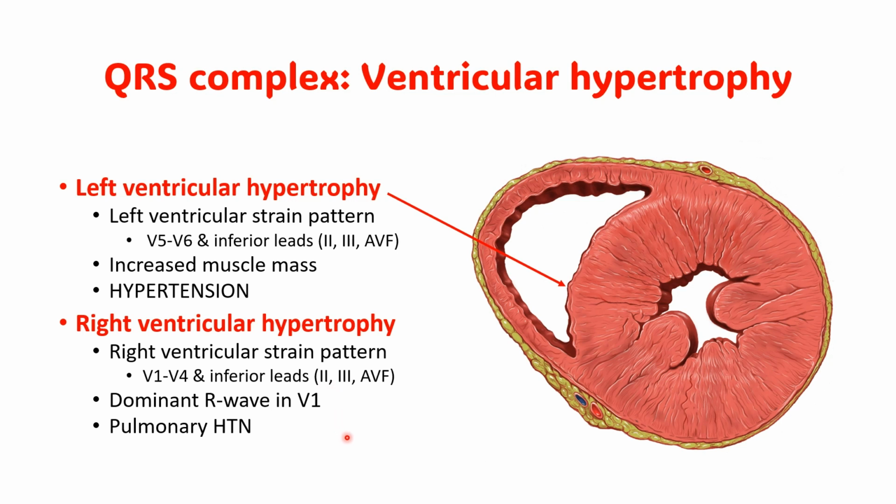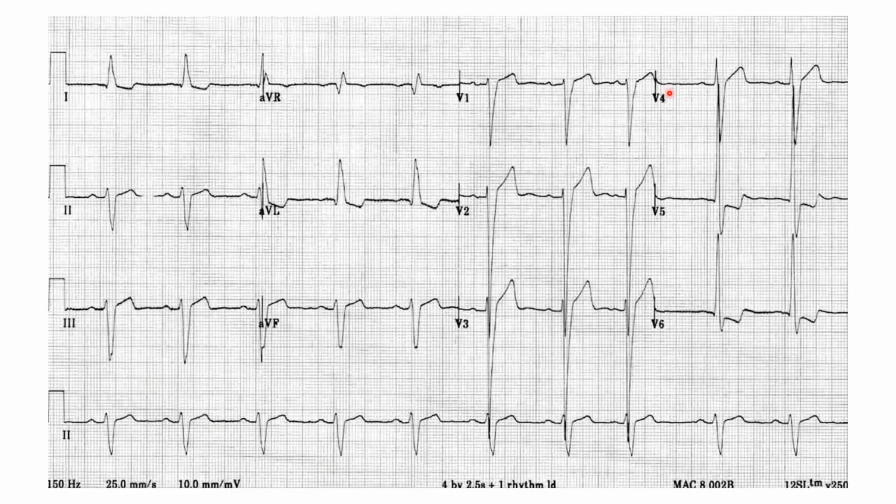Yeah, so this is a pretty classical example of an ECG in a patient with left ventricular hypertrophy. Okay, so first of all, if we look in our lateral leads, so V5, V6, and then 1 as well, and even AVL. But let's look at V5 and V6. We can see that there's markedly increased left ventricular voltages. So we can see the amplitude of the R waves is very high and it's almost overlapping with the adjacent leads. We can also have some left axis deviation.